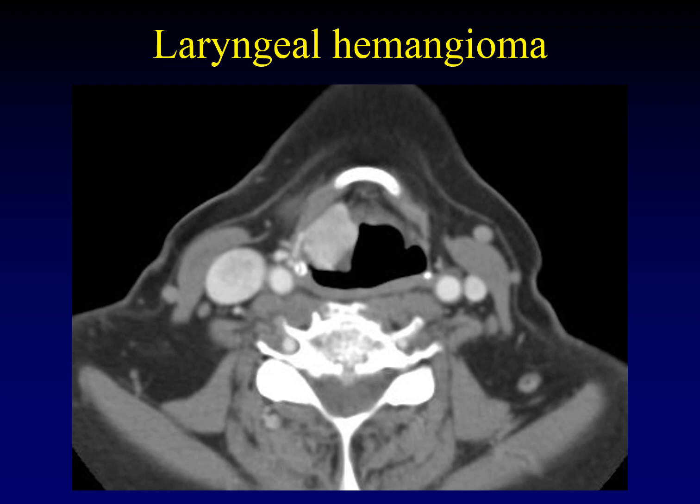I mean, 90-some percent of laryngeal masses are squamous cell carcinoma, but if it is a benign mass, then it's most likely to be a laryngeal hemangioma. It is well defined, it's briskly enhancing. Those are the clues that you're dealing with a hemangioma.